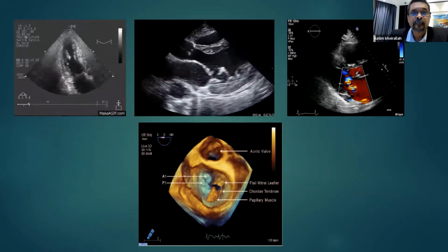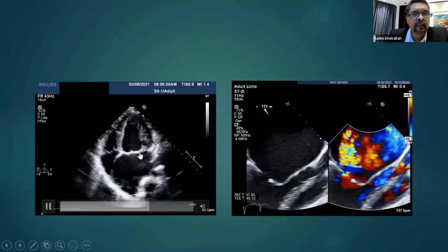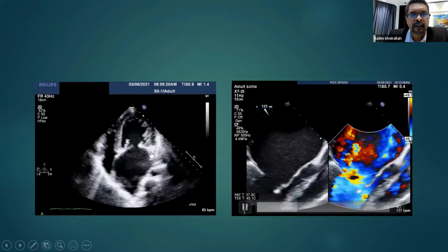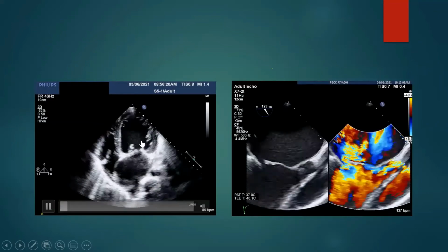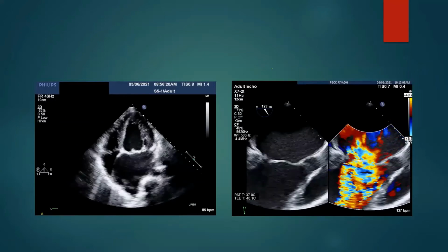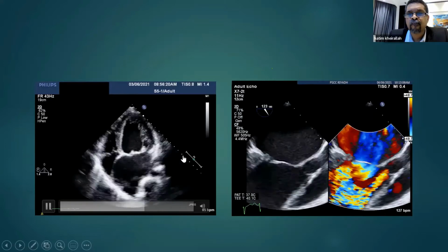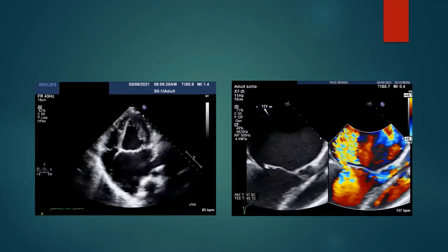Okay. Yeah. And what is this? If you look here at this transthoracic echo, how could you describe this echo? Forget about the T on the right. Just listening. This is a perforation of the anterior leaflet. Okay, perforation. Any other opinions? Usually the left atrium. Yes. With reduced LV systolic function. Flail mitral, anterior mitral leaflet. Okay. With LVH. Could be chordal rupture.